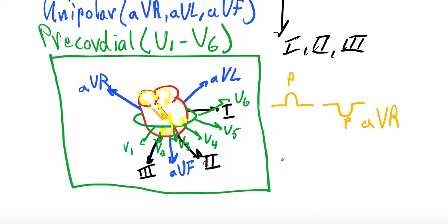That's also if you think of the QRS. So the QRS is typically Q, R, going down S. And it just depends on where you're at. Just like with P waves, if you're getting your depolarization towards that lead, so let's just talk about AVF quick.